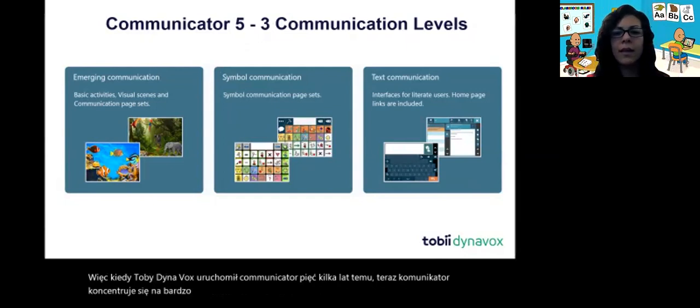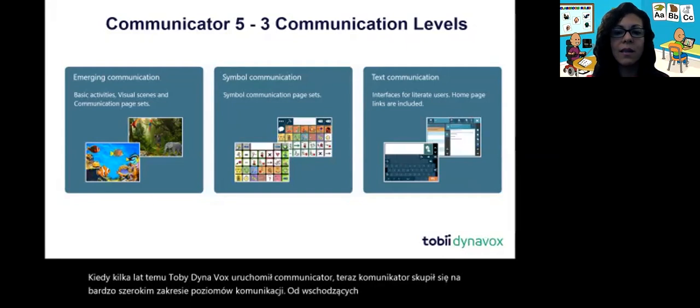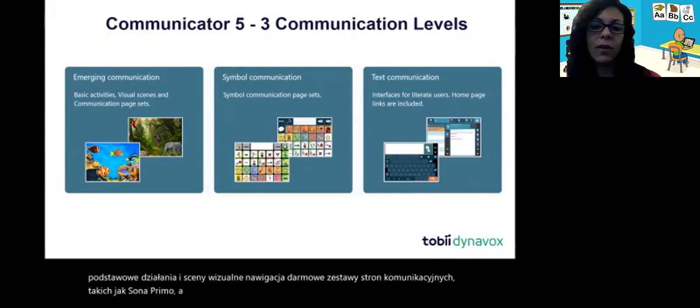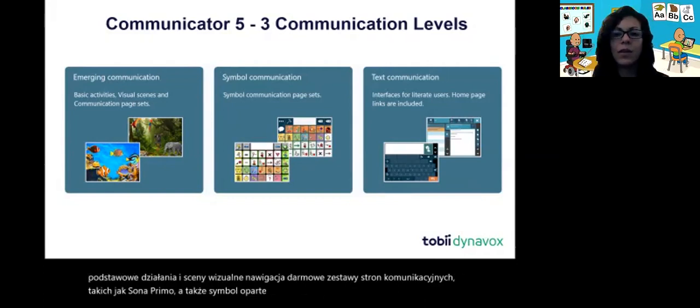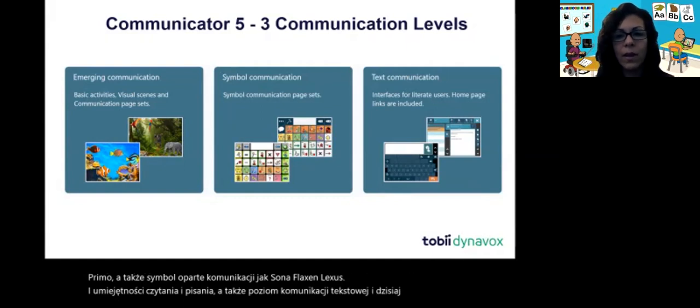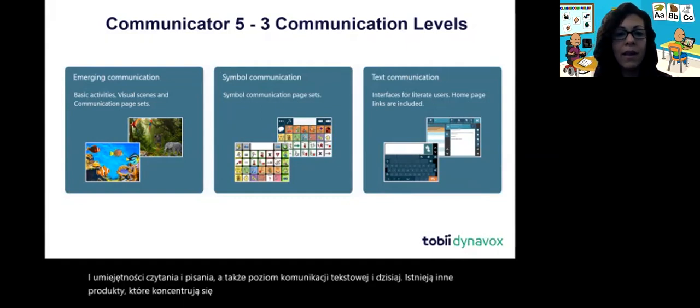So from emerging, which is basic activities and visual scenes, navigation, free communication page sets like Sonoprimo, and also symbol-based communication like Sonoflex and Lexis and literacy, and also the text-based communication level. And today there are other products that focus on these levels as well, and you know some of them. I mentioned some of them already, but we'll take just a quick look.